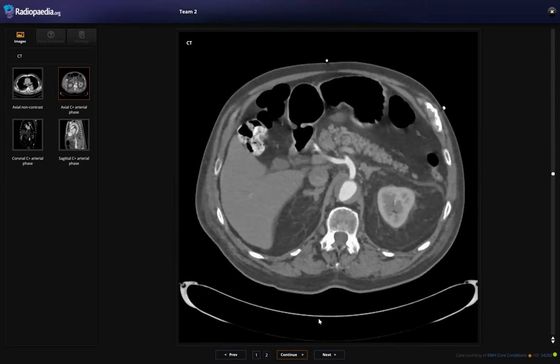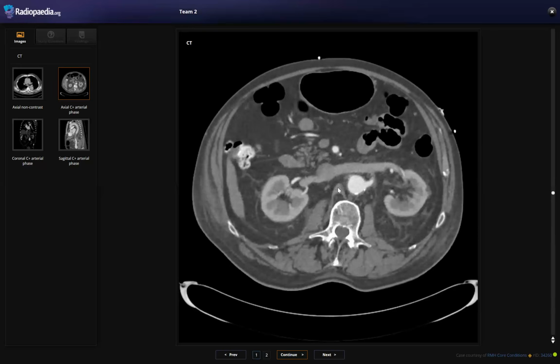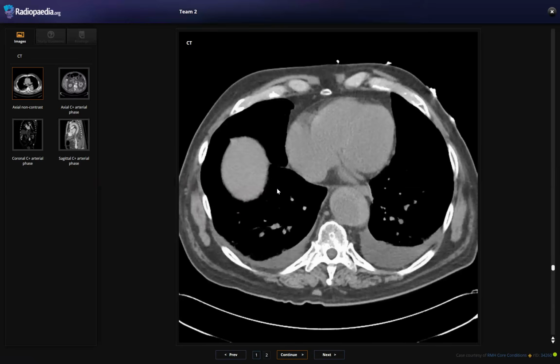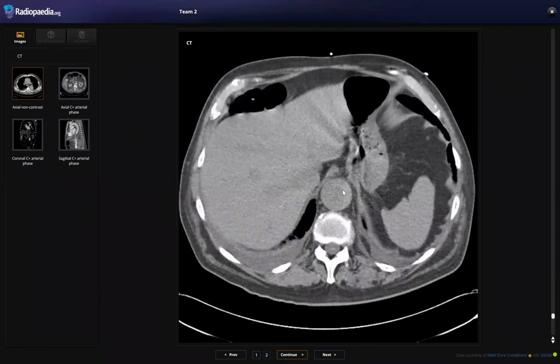Okay, perfect. Well done, Dr. Asad. All of you are very good. Just leave the control. Yes, this is an intramural hematoma, and I asked about differential of acute chest pain. Yes, you want to exclude aortic dissection, PE, or massive or tension pneumothorax from the X-ray, right, or MI.